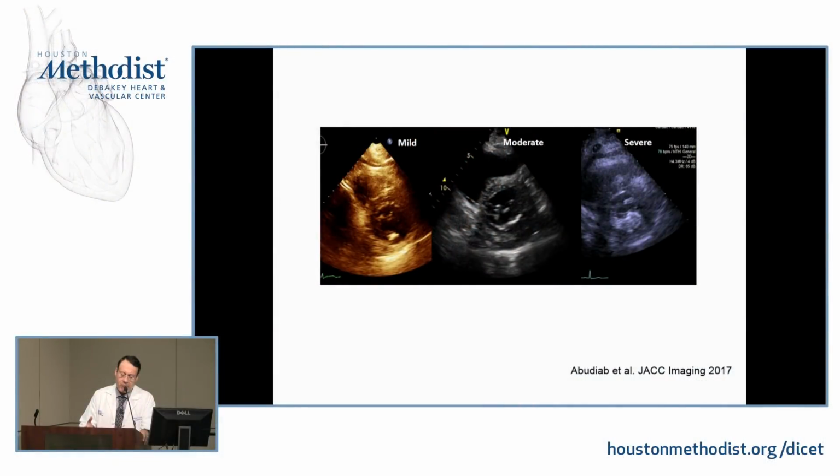Mitral annular calcification, if moderate or severe, is another challenge for assessment of diastolic function. You want to look at the severity of MAC, mild, moderate, or severe, taking into account not just the brightness of the signal, but also the extent of the signal. The more extensive the calcification across the annulus, the more likely it will produce some sort of a smallish, if you would, annular area that can affect the annular velocities.